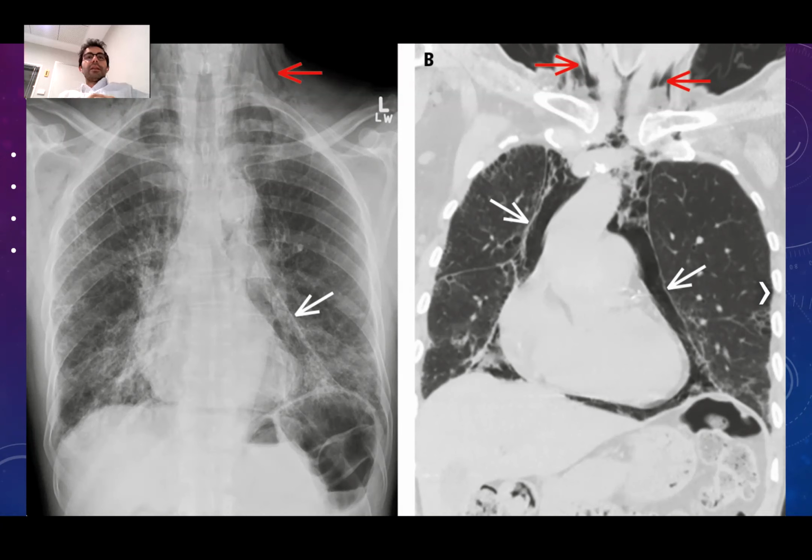That's all. Can anybody make an evaluation about the lung areas in this patient on the left in the chest X-ray? I'm seeing a lot of interstitial reticular opacities, right? Like all around, here, here, here, here, here, and here in these areas as well. So can this be pulmonary edema? This can very well be a heart failure, right? It looks like heart failure.